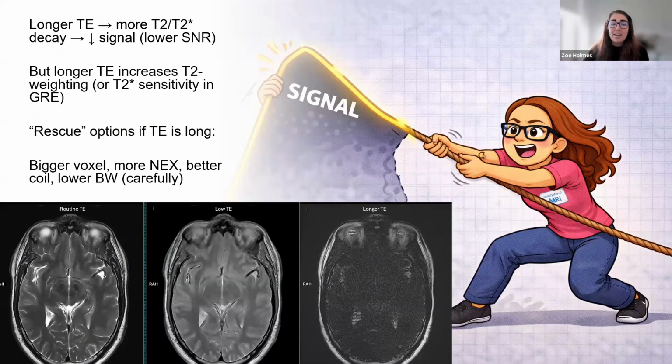So like we just said in our imaging just there, when we reduce our TE too low, we are going to potentially lose our ability to see the contrast. So if your TE is also then very long, like our last image, we are going to lose our signal to noise or our image quality. So you need to compensate. This is an extreme example, these ones here. I pushed the system way harder than it needed to go, and either end up with two non-diagnostic images.